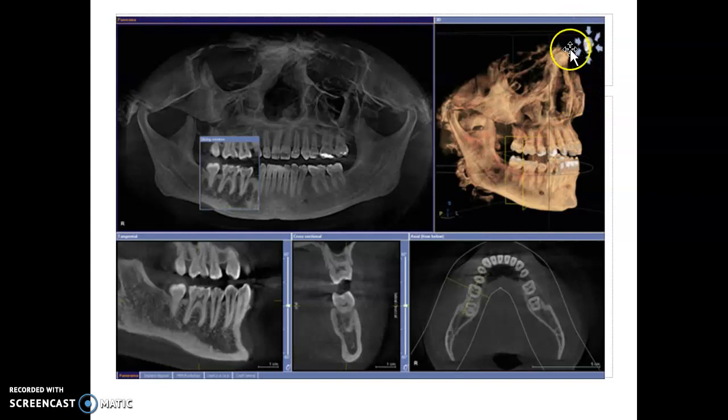Okay. Now, up here you see this little icon, and it was on the slide before. What they can do here is rotate and turn this image. So if they turned it, they could have that skull face whichever direction they wanted, and this turns with it so they can look at different areas in that reconstruction.